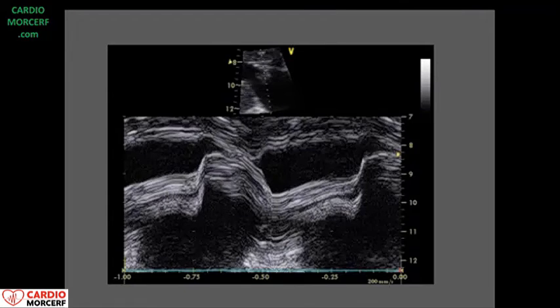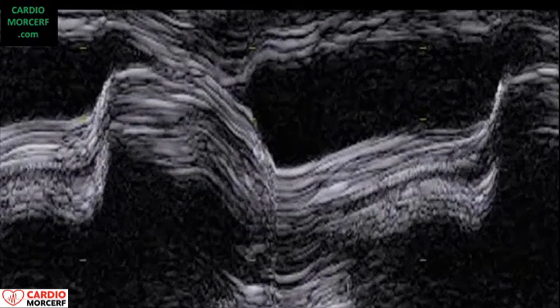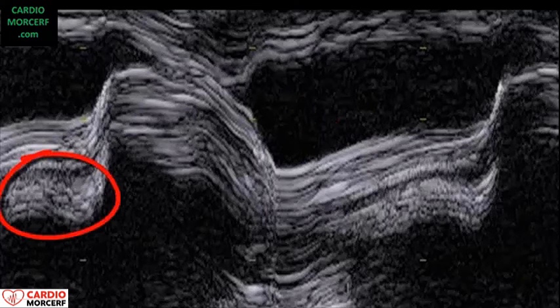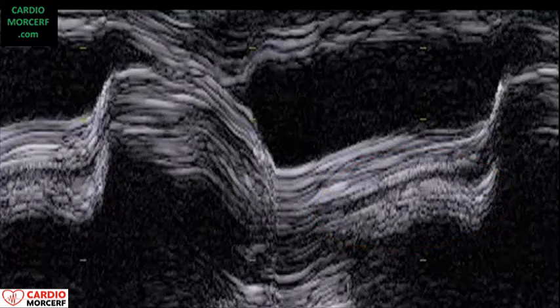One more case of heavily calcified mitral stenosis. But look here, there is also vegetation in this valve. In this location you see an obvious aspect of calcification with clear-cut lines, but in the same valve there are smudge and ragged torn paper signs of vegetations.